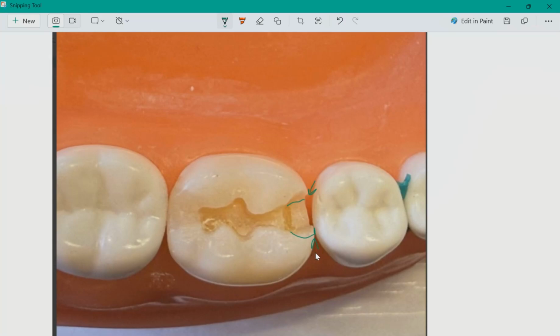And the sub would be that the proximal clearance at the height of contour extends 1 millimeter, but less than 2 millimeters beyond either. So I don't know if this would be a sub right here, possible. So reading the criteria very carefully, it might be. But I think you just need to center it a bit better.